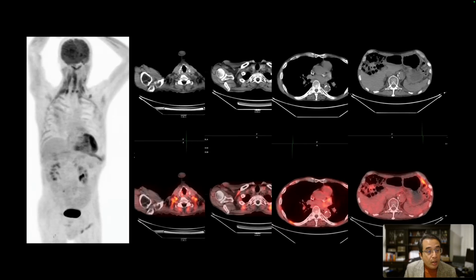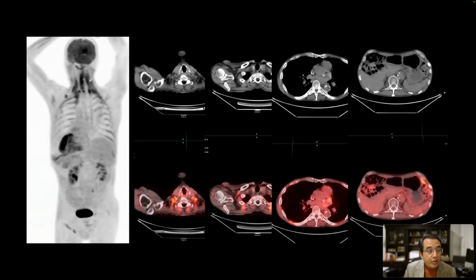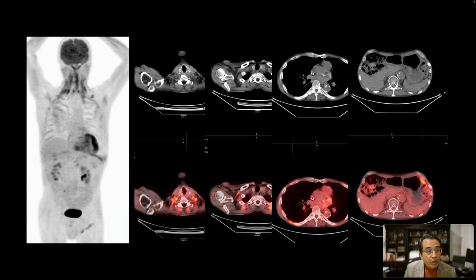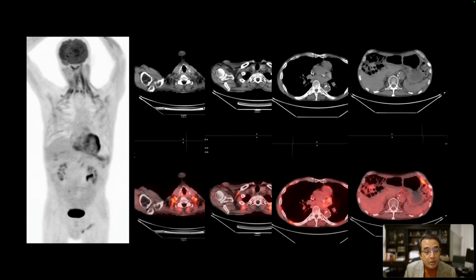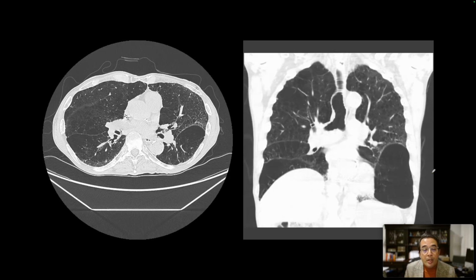Here's our next patient. On the rotating image, we find that there is intense uptake in the skeletal muscles of the lower neck, upper chest, and also the intercostal muscles. And we see the uptake right here on the fused PET CT images. And this patient was short of breath, and they were recruiting accessory muscles of respiration as they were trying to breathe. And so shortness of breath or dyspnea can also lead to muscle uptake on FDG PET.